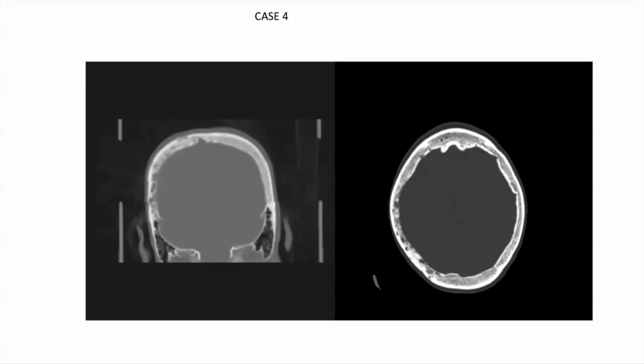So this one is happy to see 3 people felt it was Paget's, and this is Paget's disease. Paget's disease, as you know, can have a varied appearance, often expands the bone. I don't think there's much in the way of expansion.